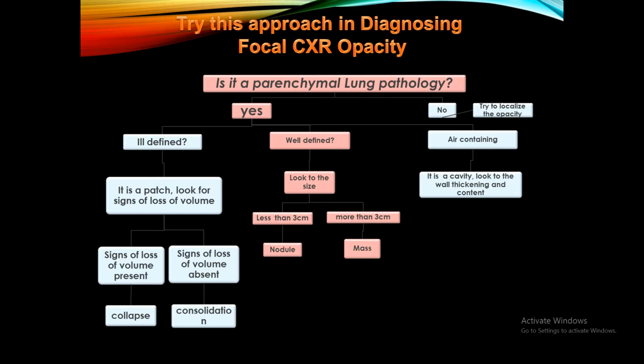Let's try this approach in the diagnosis of focal chest X-ray opacity. If we have a parenchymal lung pathology and it is well defined, so we are dealing with either mass or nodule, so we should look for the size of this lesion.